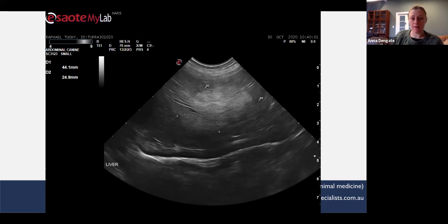But it doesn't matter. This is as far as the differentials for nodular liver change. The fact that it's an isolated lesion, I think, changes your differentials a little bit. But for the purpose of the discussion, it's interesting to look at the different causes of hyperechoic nodules specifically.